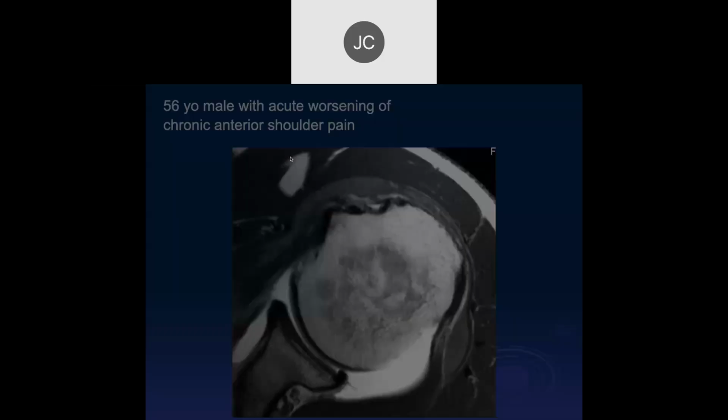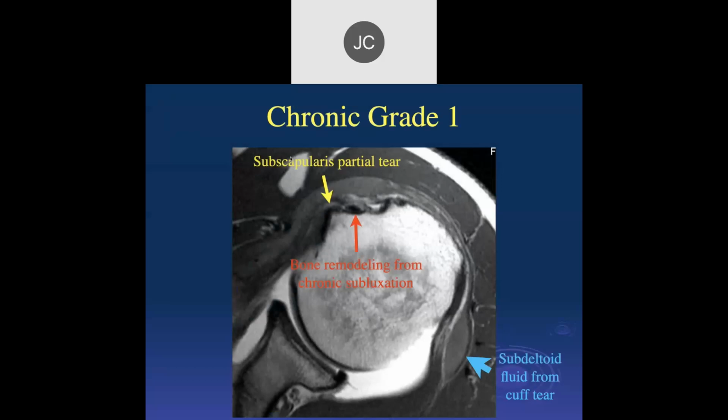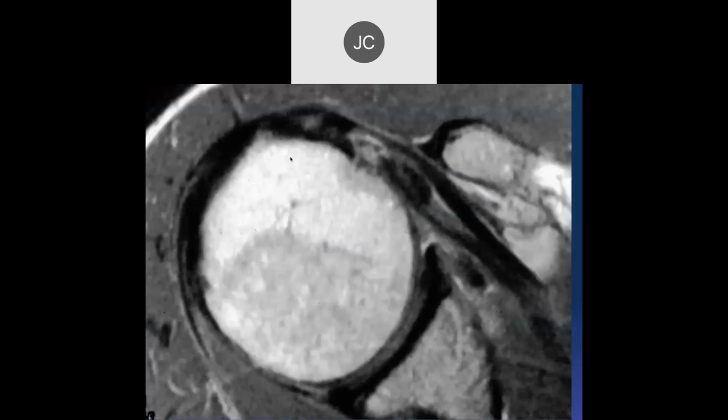Okay, I think John has, it's the last study we looked at. John has the arthroscopic grading system in Campbell's that he's going to read us concerning biceps instability. Go ahead, John.